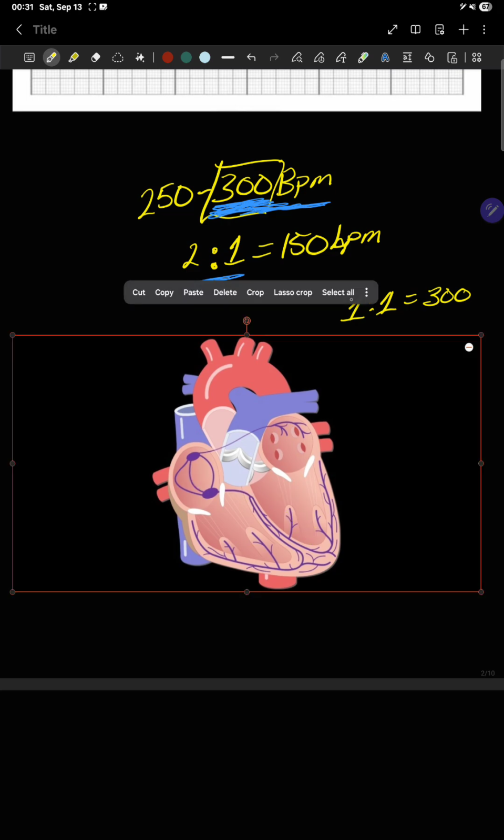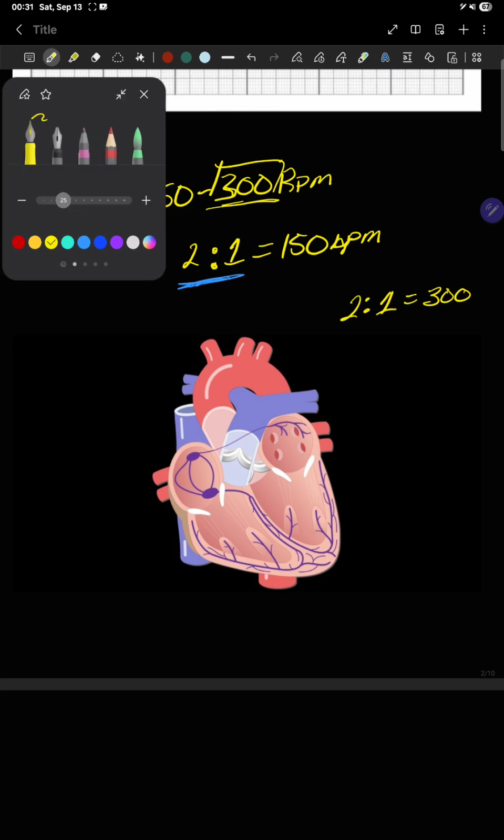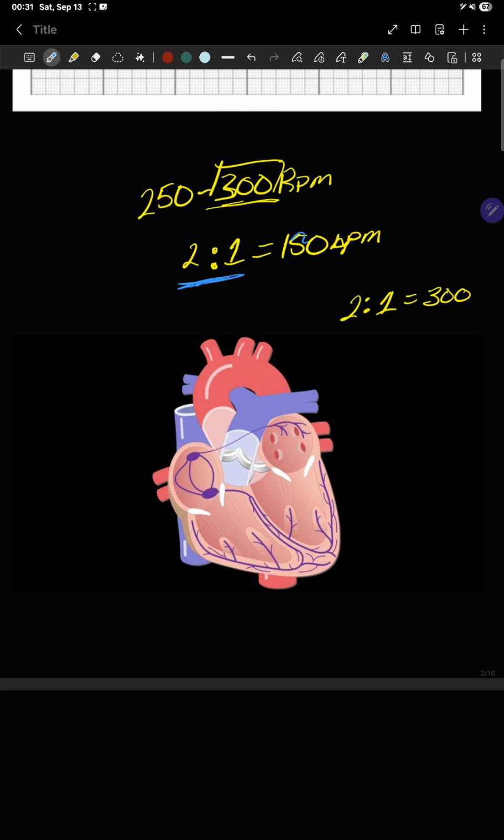Okay, so now let's say I have a 2-to-1. Now, if I have a 2-to-1, that just cut that in half, right? Because now half is coming through.